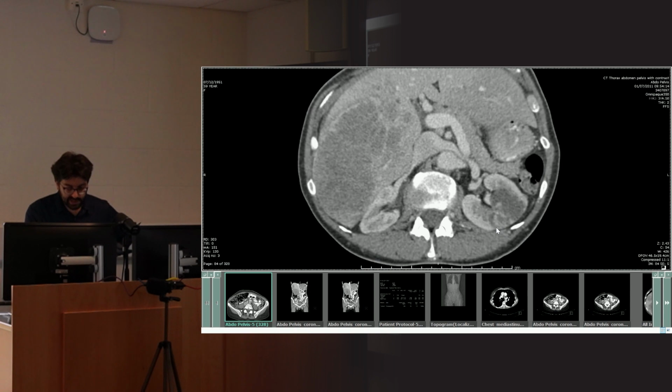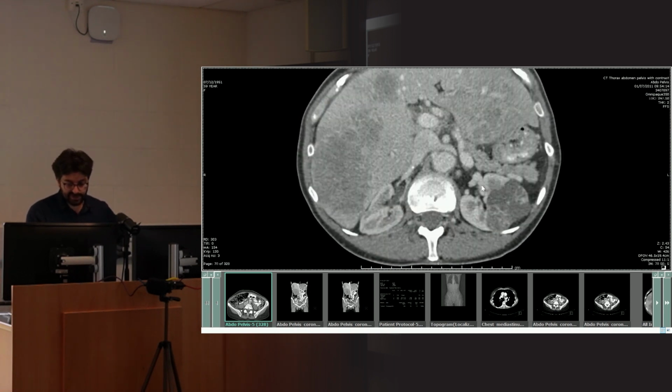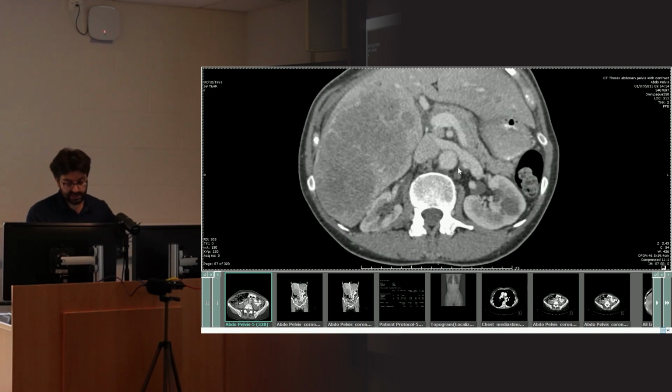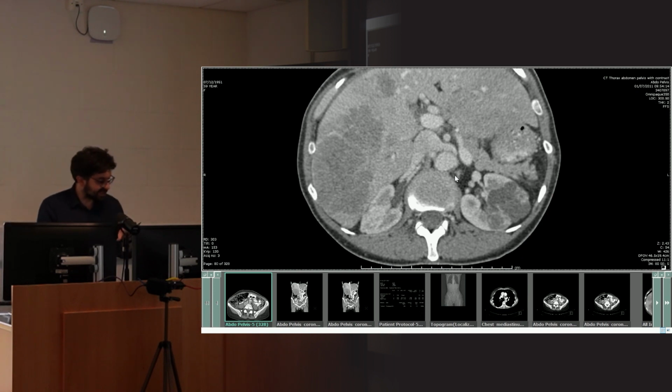These cystic tumors are usually fairly slow growing and indolent. There's no venous invasion here, which is another thing that RCCs can do. There aren't any para-aortic nodes, which is where lymph nodes from renal cell tumors generally tend to go. So you can see how you can use all these little additional features to help you come to a diagnosis and say, no, this is metastatic colon cancer, and this is an incidental renal tumor. Do you see how I came to that conclusion? I hope that all makes sense.